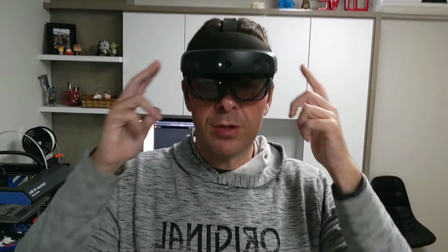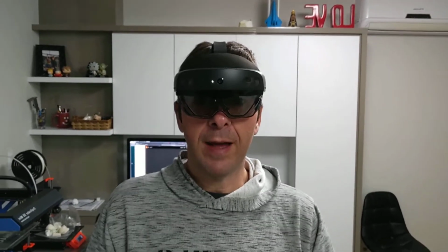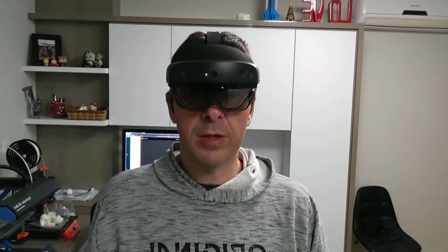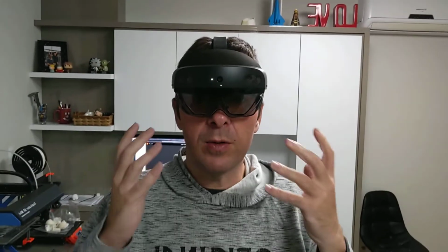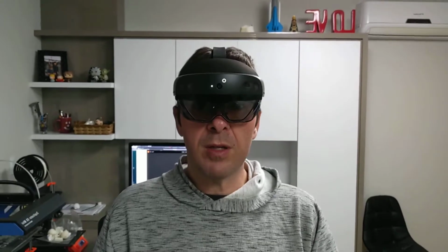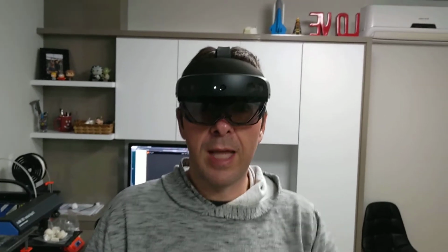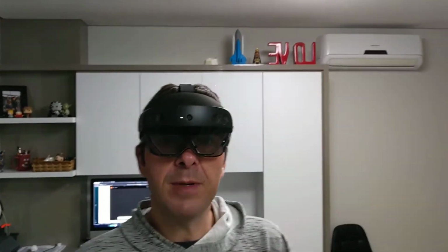I'm using Microsoft HoloLens 2 to show you how we can create a very simple app for our toolbox of implants for prosthesis, reverse total shoulder arthroplasty, and how we can use this as a good tool for teaching each step of a procedure and teaching each tool that is needed in each step. I'm going to show what I have done in very simple steps.